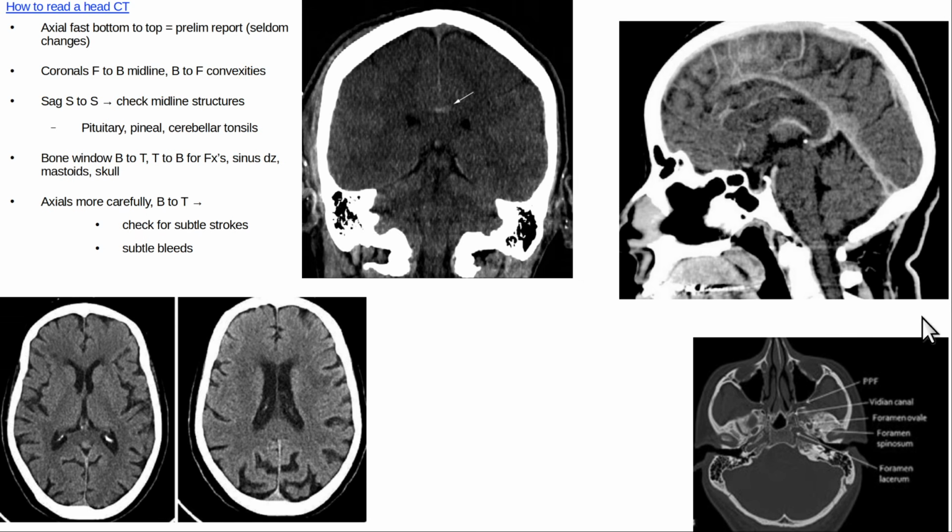And it's rather aesthetically beautiful. I think the most aesthetically beautiful thing in all of medicine is a midline sagittal brain MRI. Actually, a brain MRI is prettier than a CT.